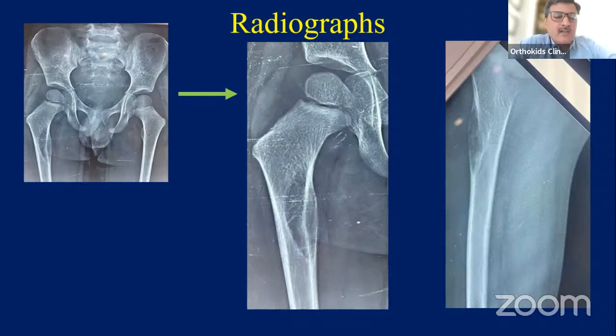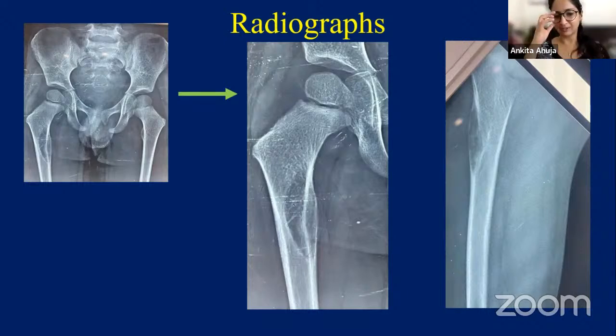Ankita or Malini, can you tell us what differentials we should think here? Of course, we are going to go for further imaging, but still, I was thinking more in terms of a non-aggressive etiology, because there is no cortical erosion. It just feels like more of an attenuation, just as Ankur sir mentioned. So I would think of something like a juxtacortical lesion, maybe osteofibrous dysplasia along those lines, because the matrix looks a little lytic or a little ground glass at areas.